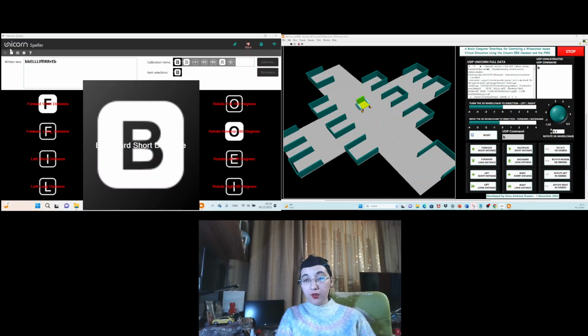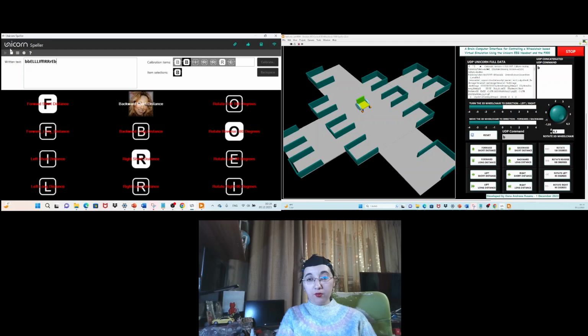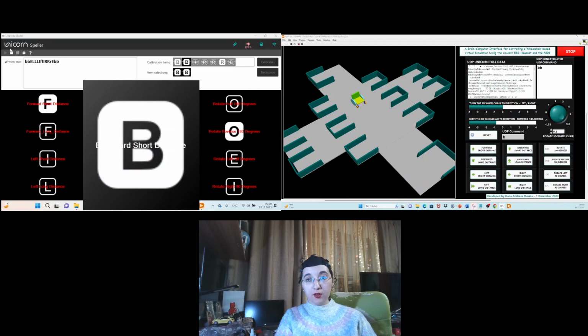Okay, that's fine. Again, backward short distance. Nice. Then rotate right with 90 degrees.